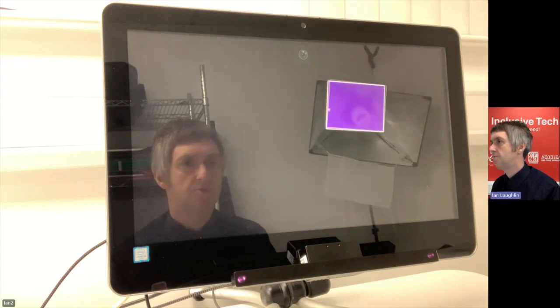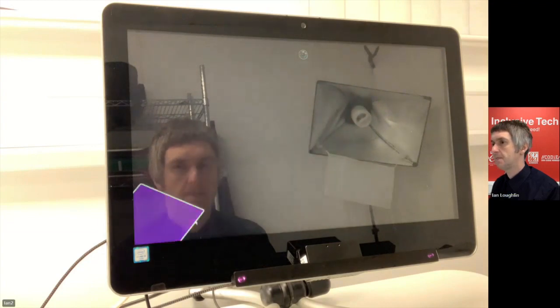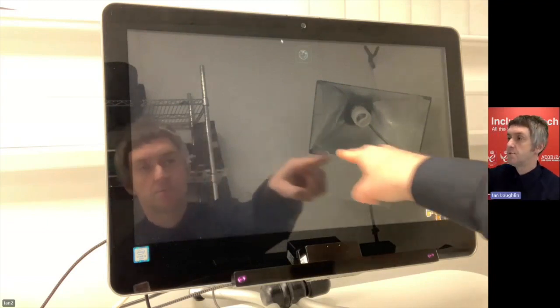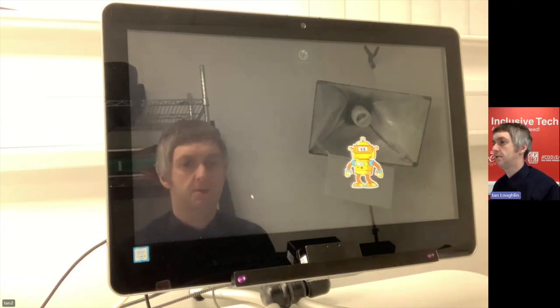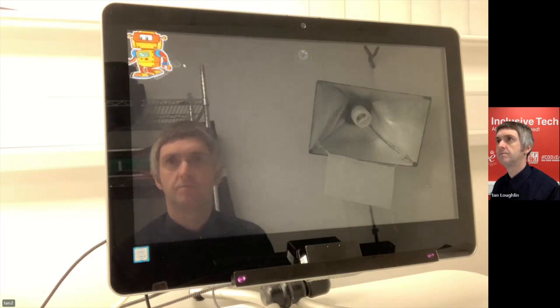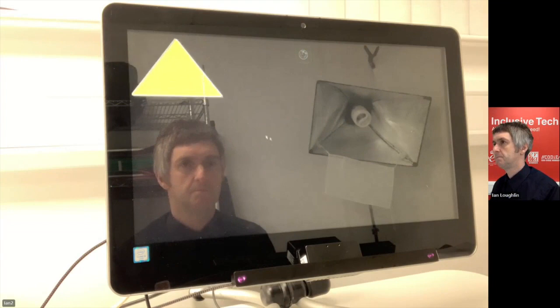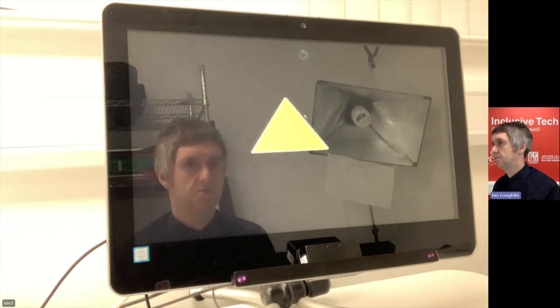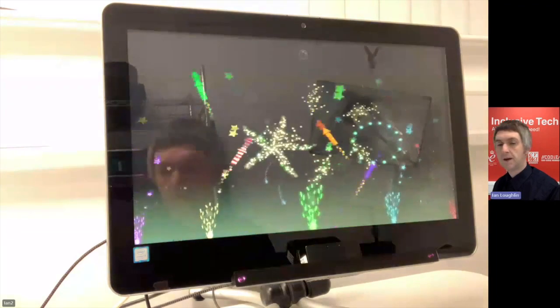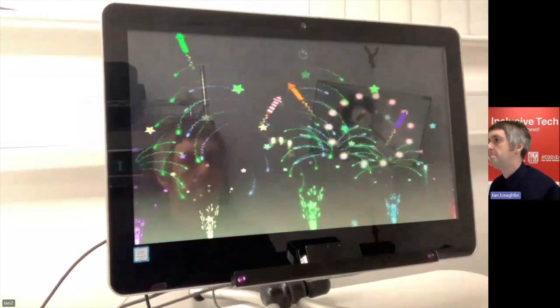So there will be 8 objects in total in the game. Okay, so let's leave the robot to move halfway across the screen, and I'll begin looking at him. And you can see the difference there. Again, with the triangle, you can see the movement when I begin looking at it. Okay, and that's the end reward screen displayed there.